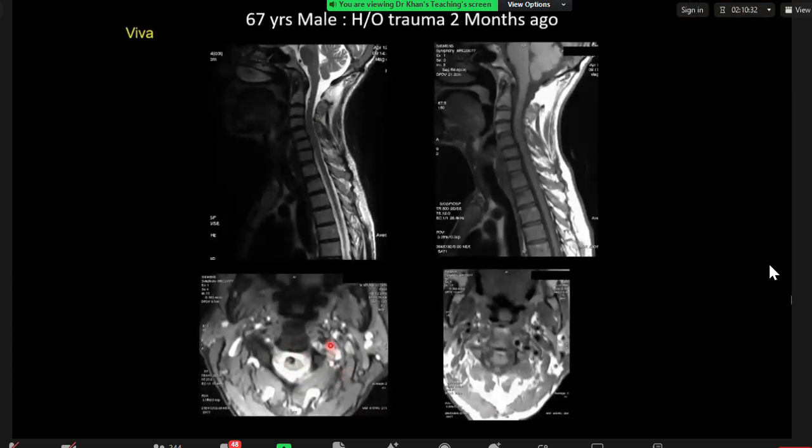Okay, so an intramedullary lesion, yeah, on the sagittal. Sorry, apologies, I can see that a bit better. So on T2, there's a hyperintensity. On T1, it's essentially isodense to cord. So a small hematoma that's now kind of maturing.